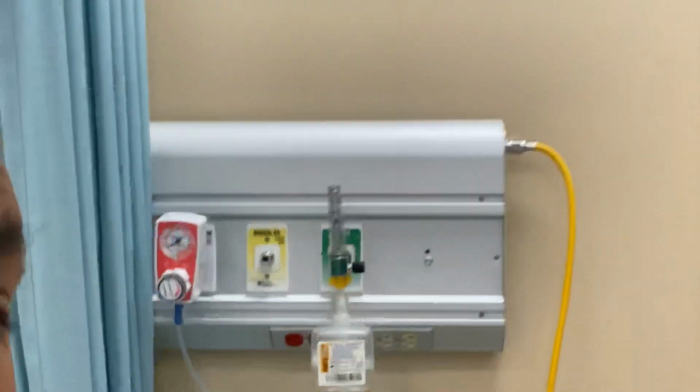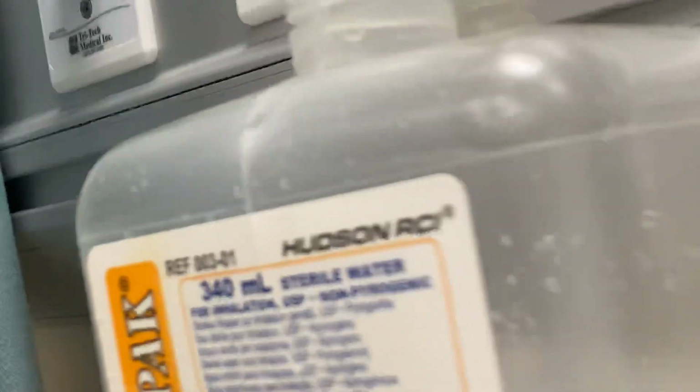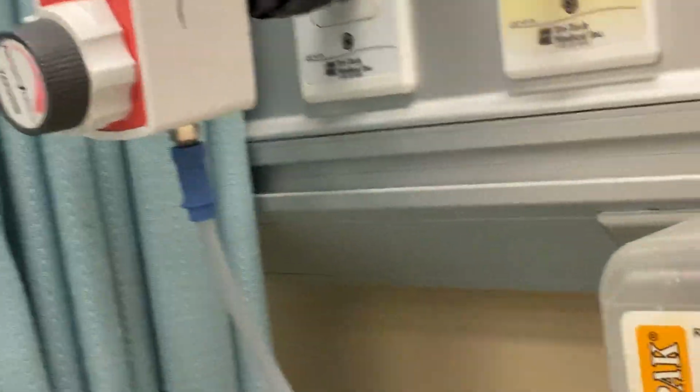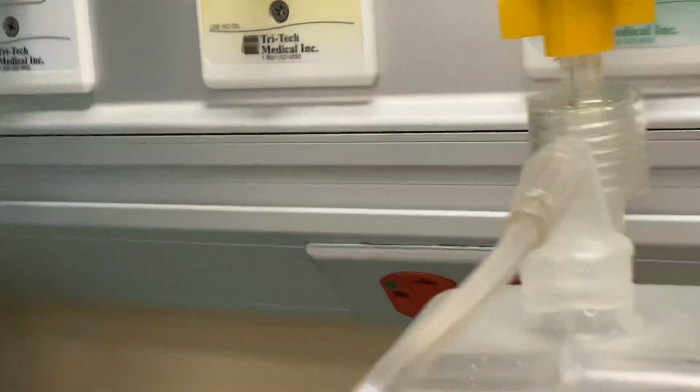And this is what it looks like. See that? Those bubbles of oxygen, that oxygen comes down through the bottom here and comes through the water. Now, the gas that's up in the top here is fully saturated with moisture, right? And I would then put my nasal cannula on here. Just like that.